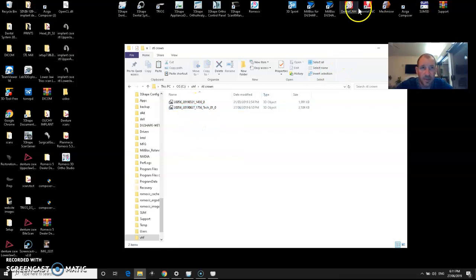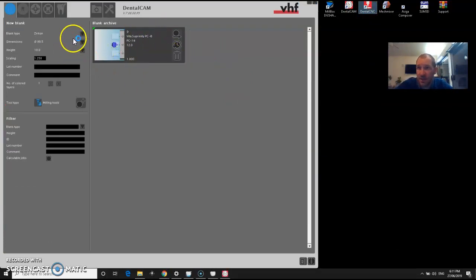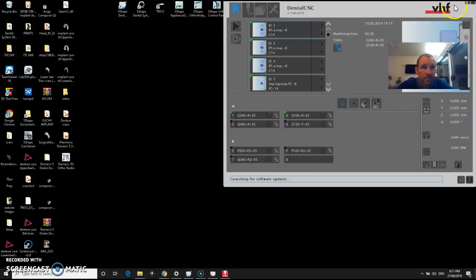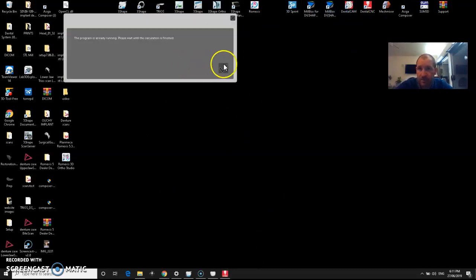So if I were to open up the VHF software now, because we have to bring it in individually, we're going to have to use this dental CAM part of the VHF software. Sorry, it's because I've got the screen recorder on. Let's go back into dental CAM.